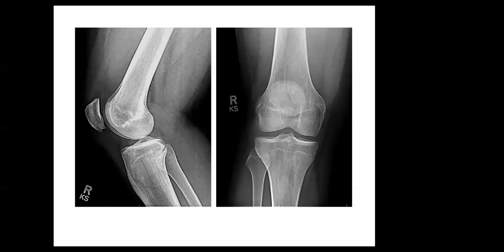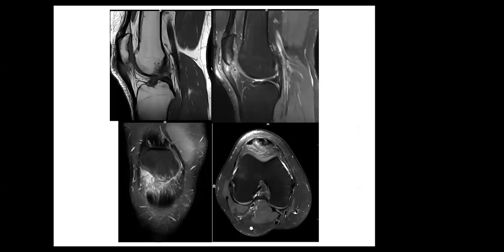Is there any further imaging like MRI? If you are recommending MRI, I can show you the MRI. Yes, doctor, I don't see any irregularity in the inferior patella. On multi-section MRI there is edema in the inferior pole of the patella. I do not see well the inferior patellar tendon attachment at the inferior pole of the patella, with bone marrow edema in the patella.